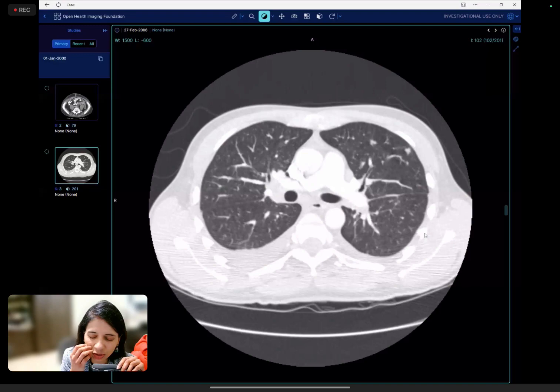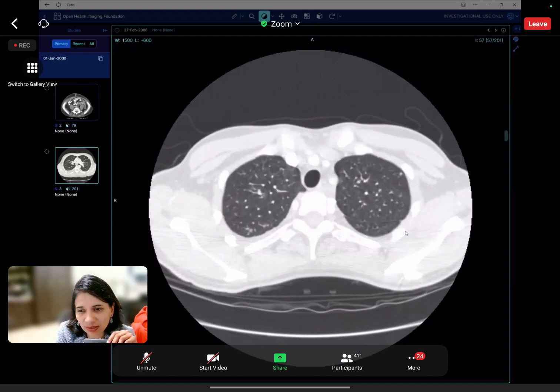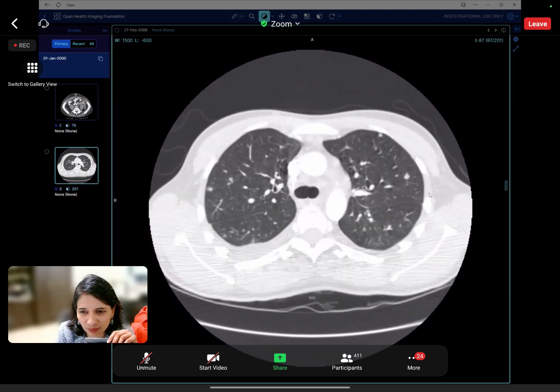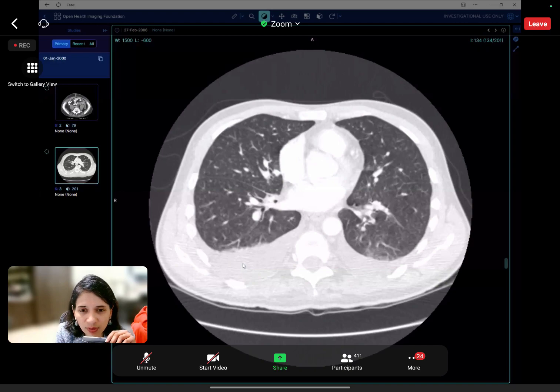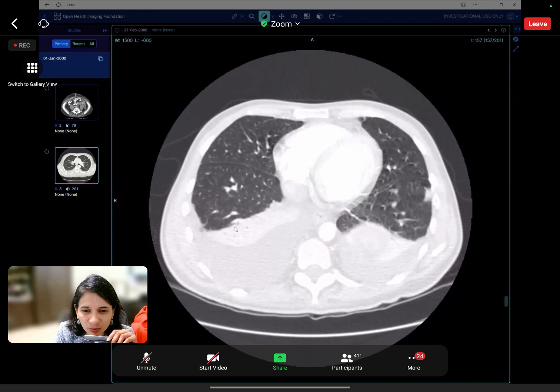The rheumatologists usually do X-ray now for all the patients before they start the anti-TNF treatment, because if there is a primary Ghon's focus or something, it will get reactivated. So routinely they do this, and this patient was just immunocompromised, and that's why he had focal lesions and the tuberculosis. Again, you have to think about tuberculosis. Otherwise, if you send the pleural fluid for normal culture, it will come back negative, and you have to specifically ask for AFB.